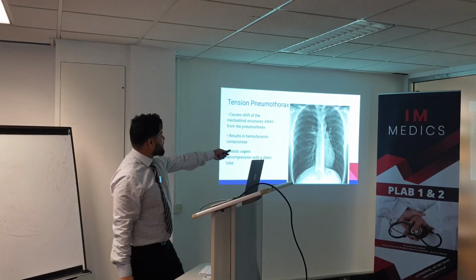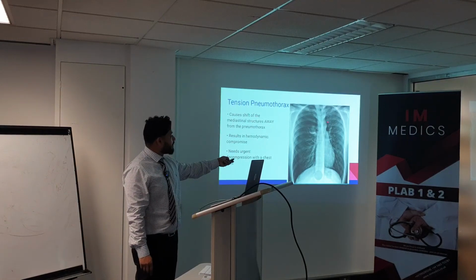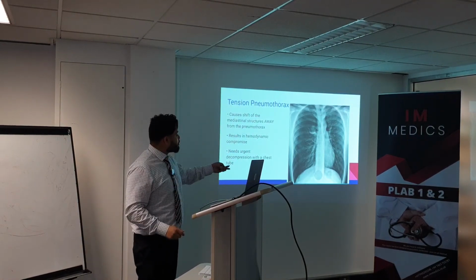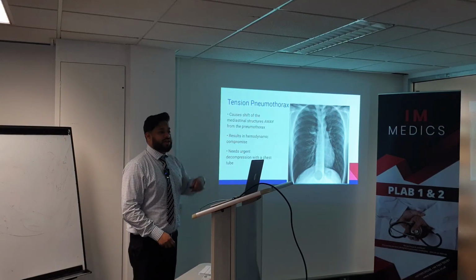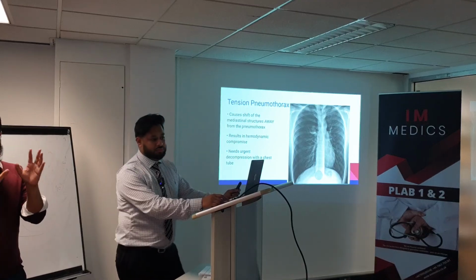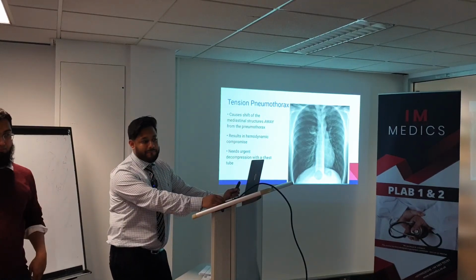And what's the examination? Look at that. Tension pneumothorax here, he was just telling you about. Can you see the tension? Remember, tension is push. It's pushing the pipe to the other side. And don't forget cardiac tamponade and tension pneumothorax. Very close. But hyperresonance, absent breath sounds, stand on that.